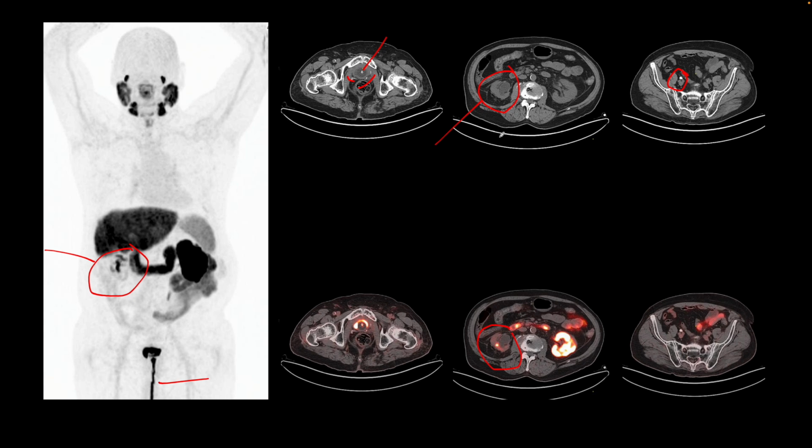And so this was shared by a colleague from another institution. And like I said before, these are the kinds of findings that may be missed by physicians who are trained only in nuclear medicine and not in radiology. So be aware, and if you are one of them, then learn from such misses from other people. And so the stone is also seen here on the fused image.